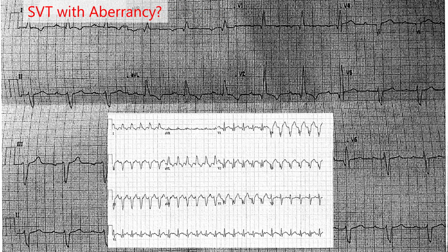Well, here's a picture of the tachycardia just for your reference, and you see that in the inferior limb leads it is not looking very different in tachycardia versus in sinus rhythm. In the anteroprecordial leads, it's looking different, right? You see this QR complex without an S in the anteroprecordial leads, but when you go lateral to the lateral precordial leads, you see how V4 has a very similar appearance, but you see this subtle difference in the notching, right? V5 and V6, although from a distance they may look very similar, there are some variations. Even in V4, the notching is different.